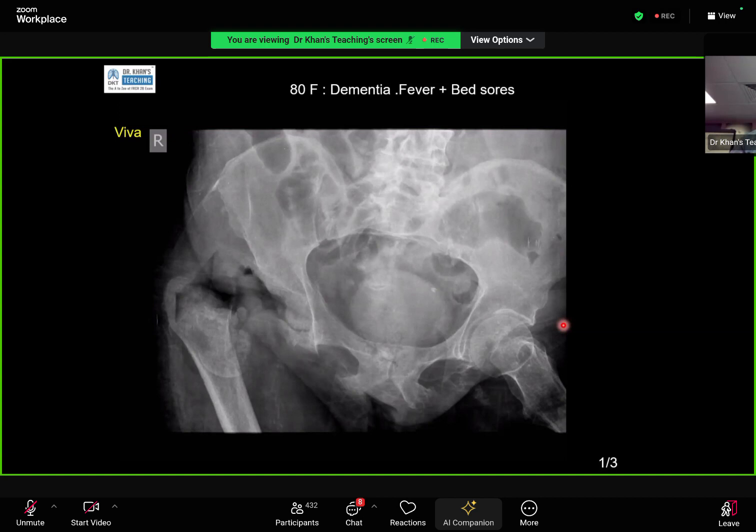What is happening to the surrounding bones? So there is osteolysis of multiple bones, particularly the pubic rami bilaterally. Right. So in this particular case, we can see that there is bony destruction. This ischium. The acetabulum is completely destroyed if you compare it with this acetabulum. And where is the head of femur? That is gone, actually. It's all eaten up. And even the neck is eaten up.